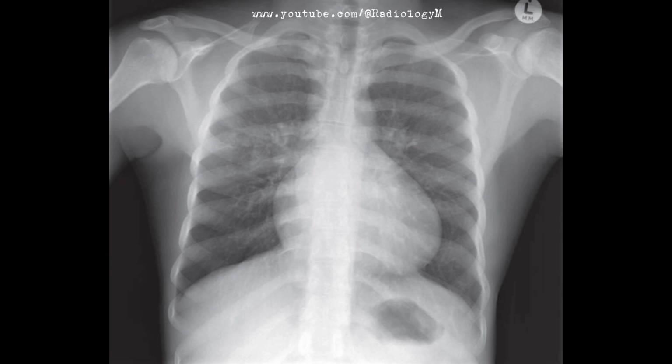Infective causes of the lung opacification, such as bacterial pneumonia, are highly probable, especially in the context of sickle cell disease, where patients are prone to infections due to functional asplenia. To further evaluate this patient, I would recommend a full blood count and a peripheral blood smear to assess for sickle cells and other hematological abnormalities.